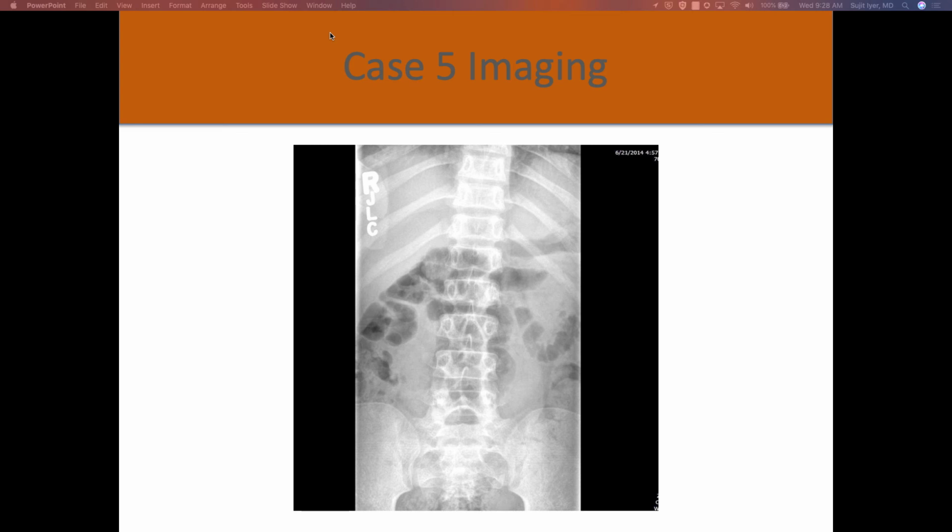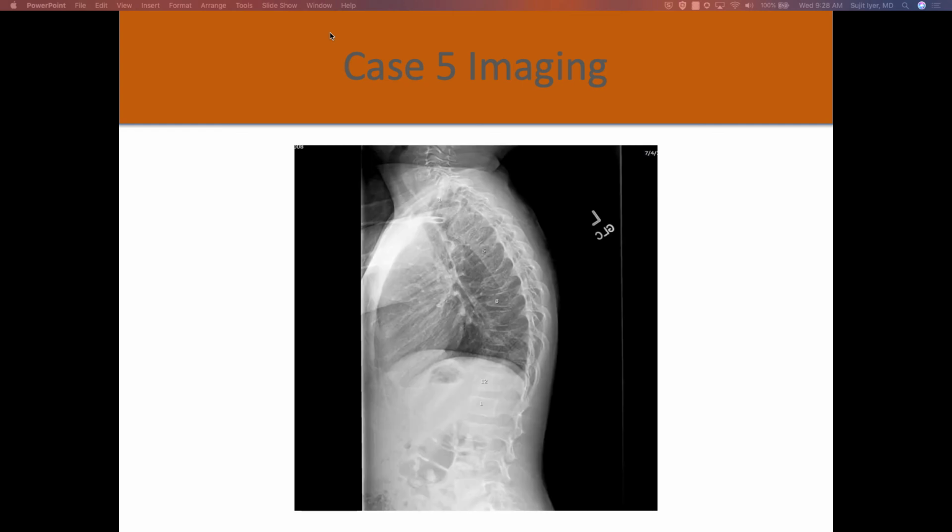Is there anything else that you see that's abnormal or asymmetric already? Non-specific bowel gas pattern. No signs of obstruction. The next one's empty, just has a lot of. All right. So we'll go to, and then we'll have Dr. Leake discuss both.